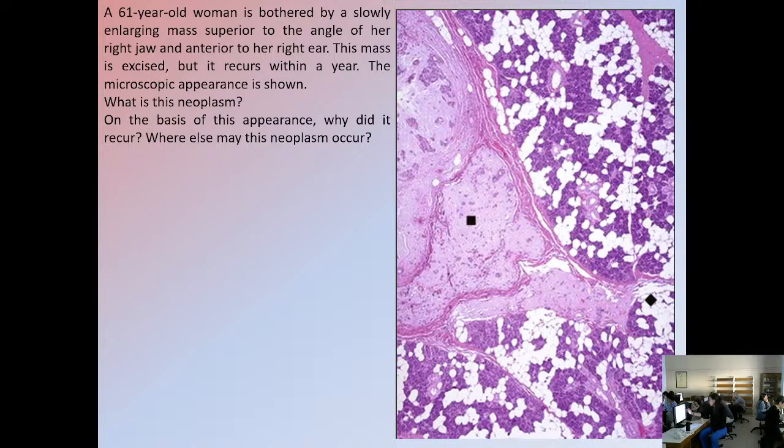So where are such structures evident? Yes, here. This is normal, and there is some amount of fat tissue as well, and it's not necessarily malignant. However, you can see that the pleomorphic adenoma gets its name from the various appearing stroma. That's why it's called pleomorphic, because the stroma is strange. It has some areas like cartilage, other areas that look like a mucinous background.